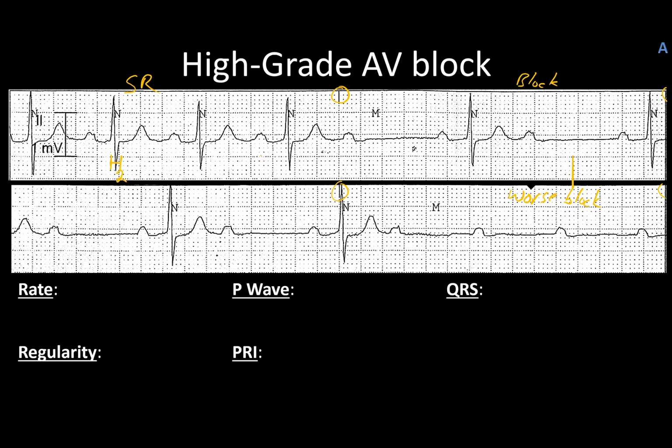That's a 2 for the QRS. We'll measure from here to 7, and 21.